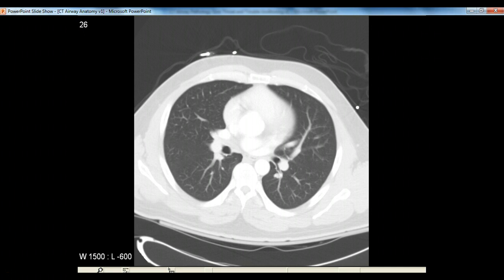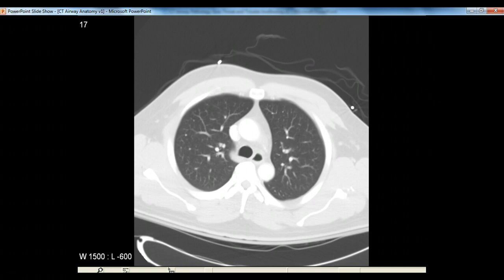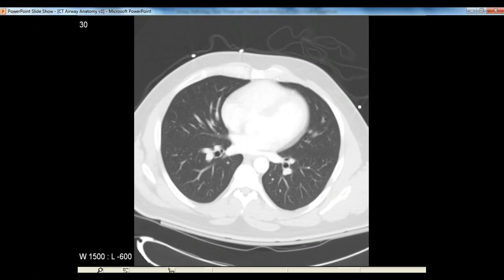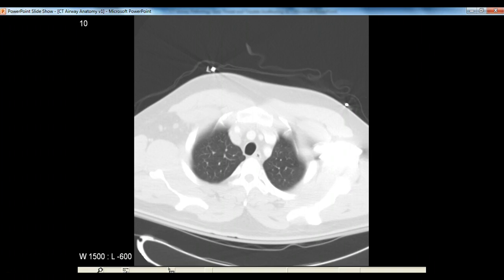So the aortic arch comes medially or midline out from the top of the heart. We're in the heart now. Look at that big bright white structure. We'll go back up it, comes across, crosses over, forms the arch, and then it descends to just to the left of the vertebra there, left of the vertebral column, and follows down as the aorta. Now the other structure that you can see here is that little tiny irregular shaped black structure just to the left of the trachea. And that's the esophagus, so it's slightly open there in that view on this patient.